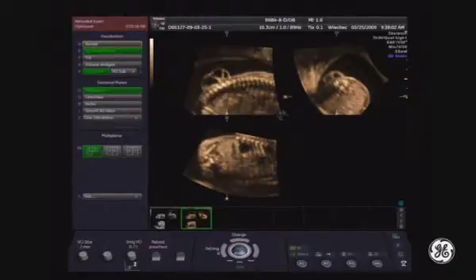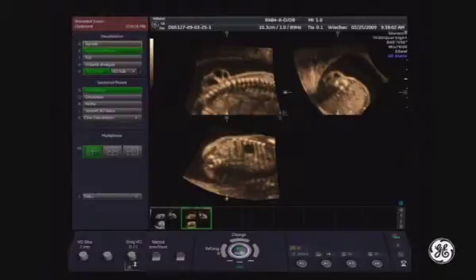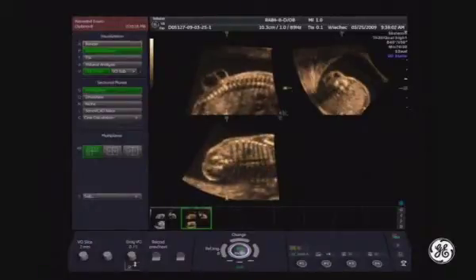Then I will move to the reference image B and I'll bring the pivot point to the vertebral body that is presented. This demonstrates automatically in A-plane the line of the vertebral bodies. You see that the arches are seen until here, but they are not followed lower.